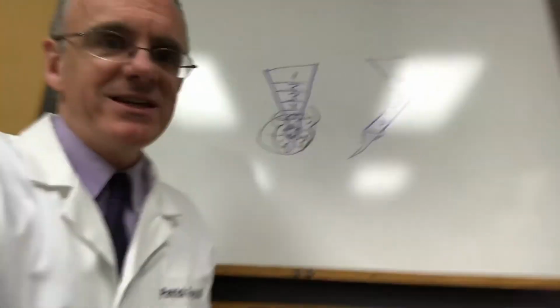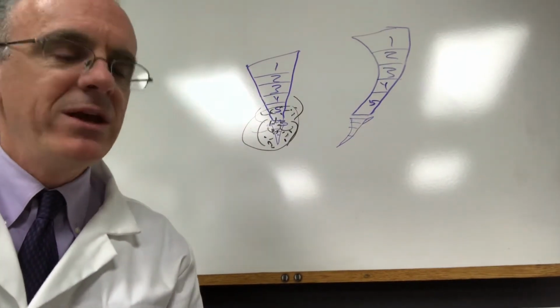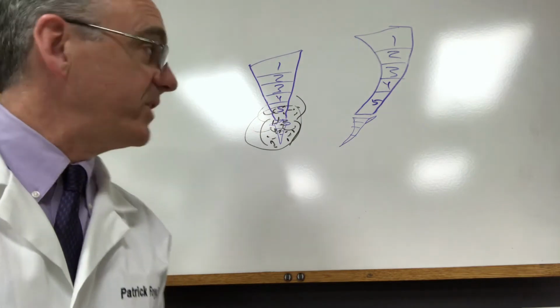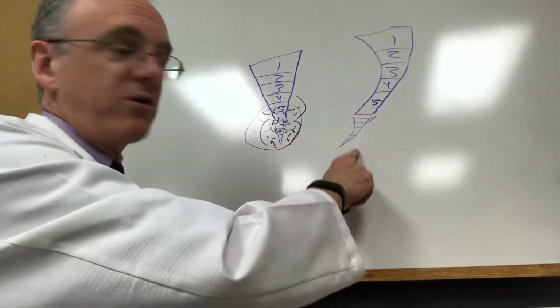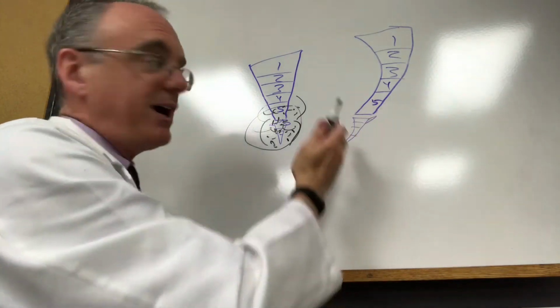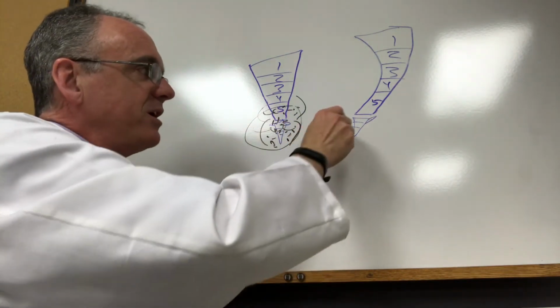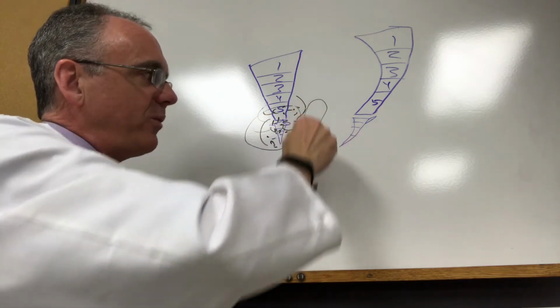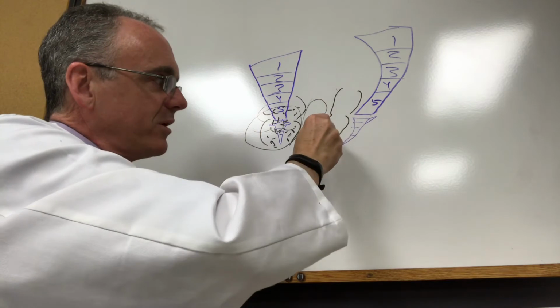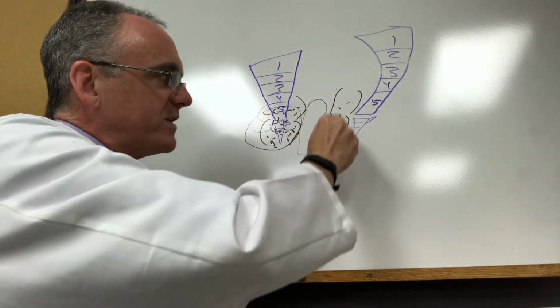So now let's take a look. I'm going to change this camera angle to avoid the glare a little bit. So now let's take a look from our side view. Well, on our side view, which is over here, this is behind you, and this is inside of your pelvis. Well, the bladder would be all the way up front here, and then your colon would be here, with its stool.